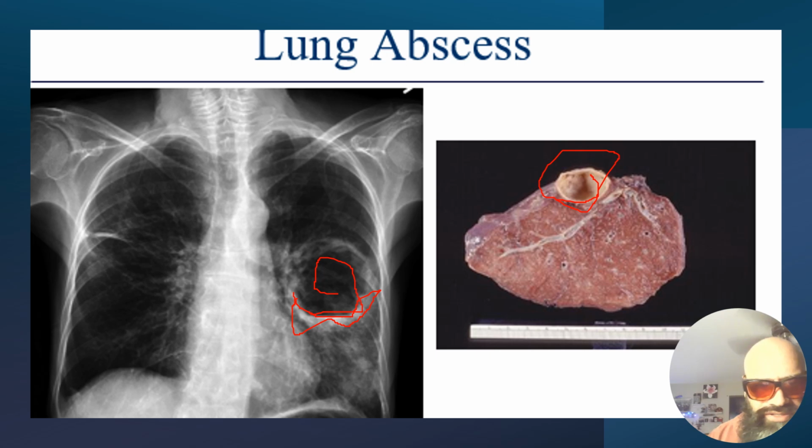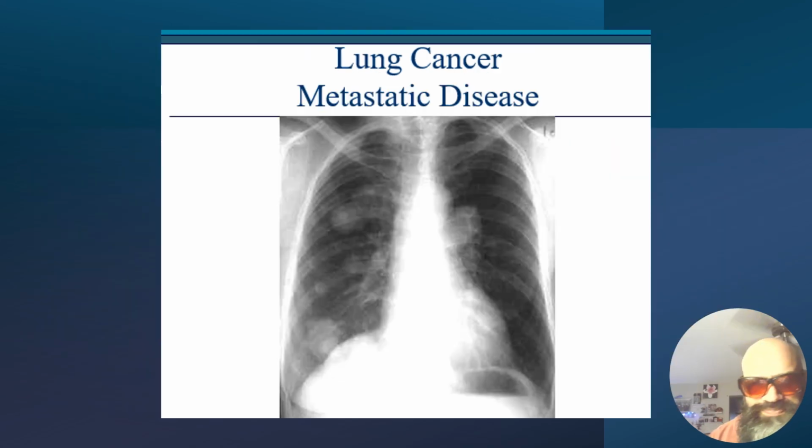Okay, so if you see this associated with a lung abscess, we discussed the metastatic disease, particularly lung cancer has a strong affinity to metastasize to bone. Surrounding bony structures in the lung are your sternum, manubrium, clavicles, and vertebral body and thoracic ribs. So these are multiple nodules throughout the entire lung region. Sorry, I'm not very good at this. I don't have my mouse, but yeah, so we have these multiple nodules. These are consistent with metastatic lung cancer.